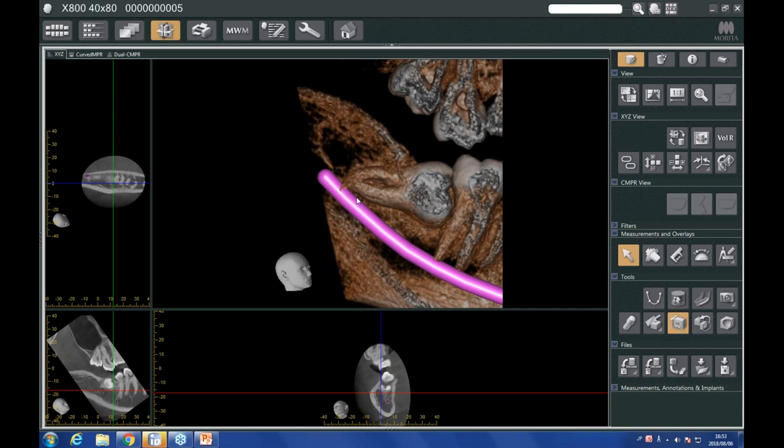So again, this volume rendering along with this dynamic cut is a good way to show the patient why you're choosing a particular treatment, or to encourage them to choose a particular treatment and be very well aware of the risks beforehand. So this basically concludes what I'd like to say for Idixel.